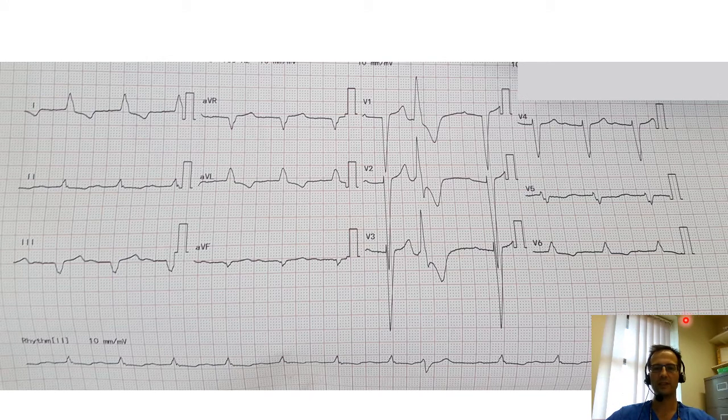What about this ECG? Take a moment to have a look at it and interpret it for me.